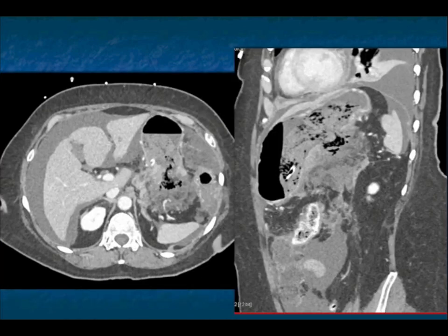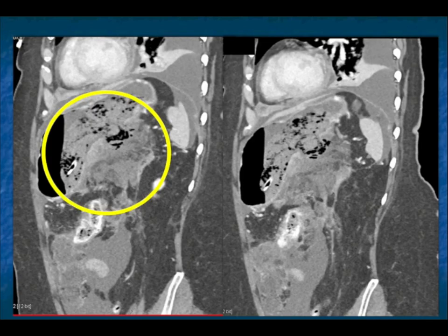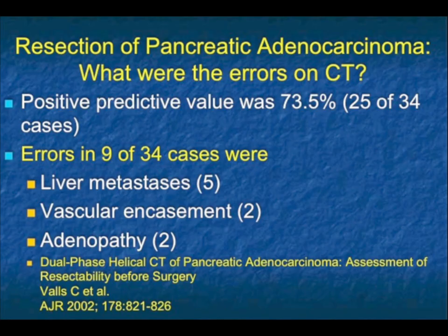And sure enough, as you scan a couple days later, the tumor now has grown through the posterior wall of the stomach, and there's a perforation with peritonitis. This is pretty rare. I've seen ulcers, of course. I've seen fistulae. Direct extension by tumor with then perforation and an abscess is indeed a very rare finding.